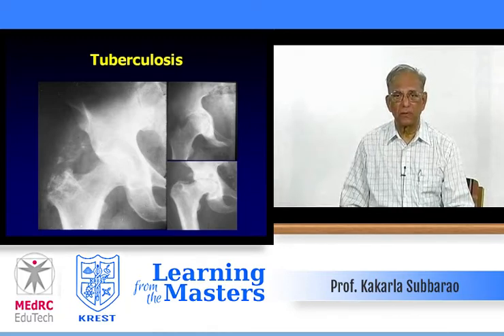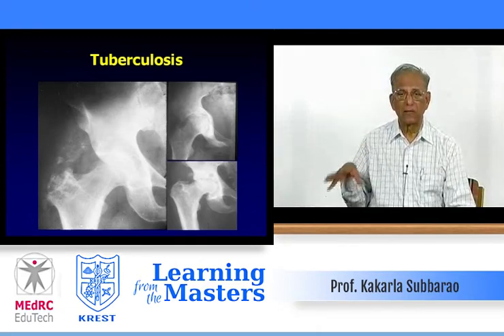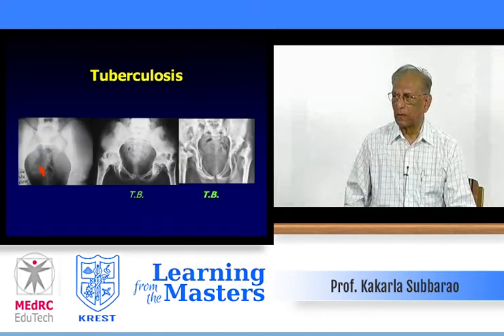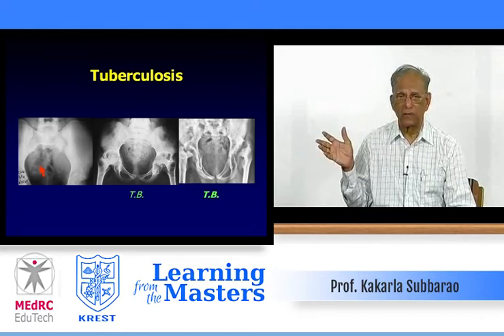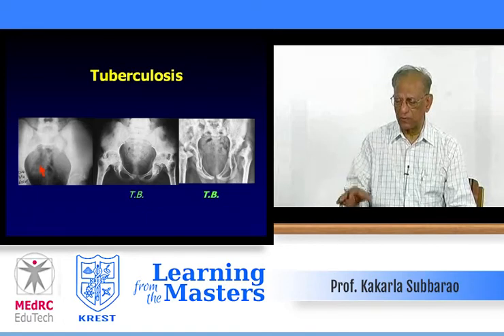You won't think it is tuberculosis, but slow growing tubercular bacilli and slow infection over a prolonged period may induce osteosclerosis. We said earlier, bilaterality is rare, but you see in the hips bilateral involvement of tuberculosis. The one down, you have seen the sacroiliac joint already with the abscess formation.